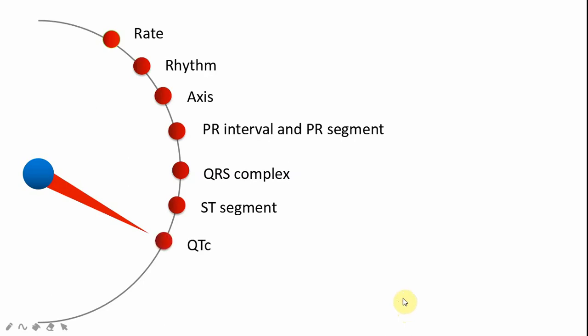And after that, we have looked at the QTC in this patient's ECG, and the QTC is normally 350 to 450 milliseconds. If there is prolonged QTC, a lot of things can happen. It can be because of hypokalemia, hypocalcemia, hypomagnesemia. It can happen because of myocardial infarction. It can happen for electrolyte abnormalities, hypothermia, a lot of different causes of prolonged QTC. There are different drugs that can cause prolonged QTC. Even erythromycin can cause prolonged QTC. Ondansetron can cause prolonged QTC. Not necessarily they will cause complete heart block though.